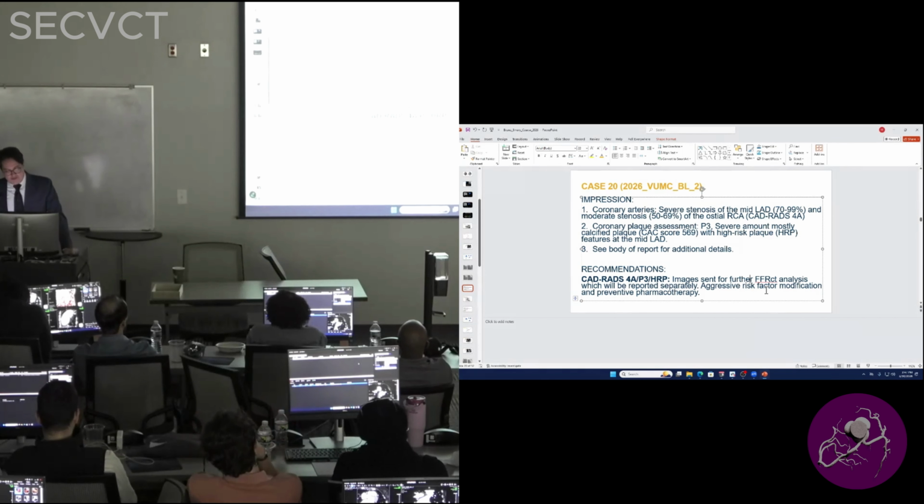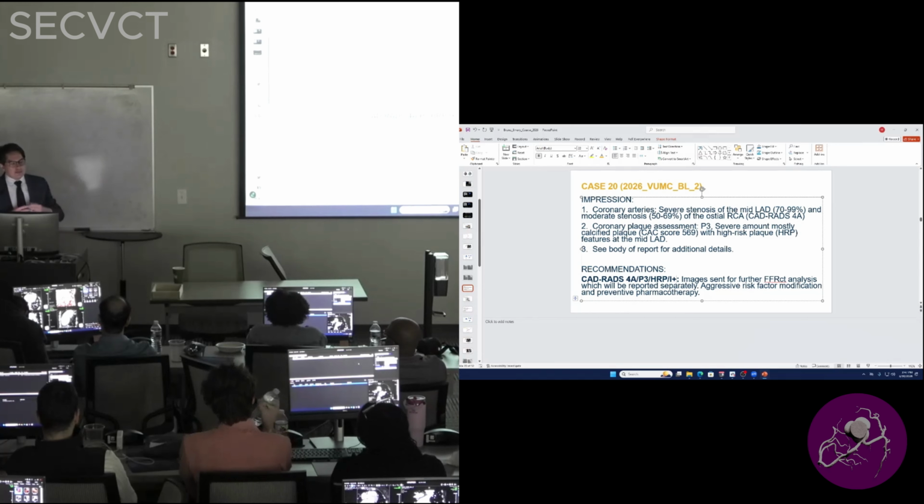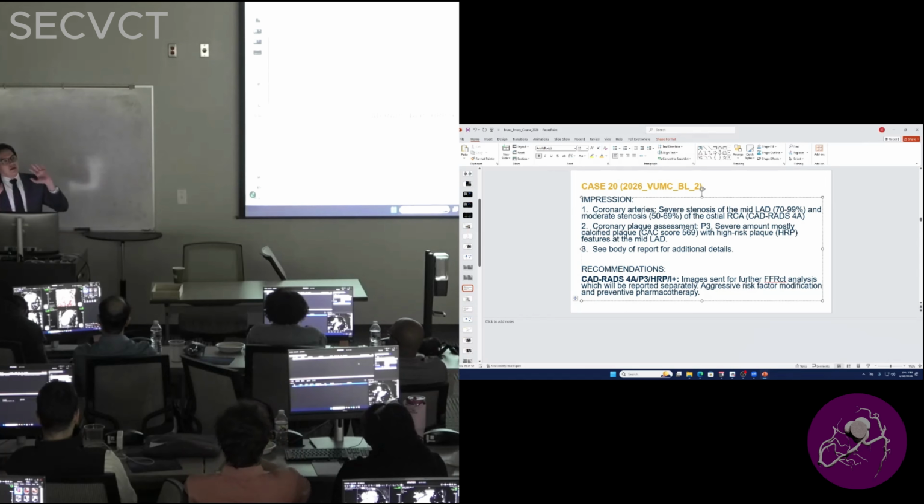So we sent the FFRct analysis. It was FFRct positive, so we can add I plus here, right? I plus because FFRct is functional testing. Also, in some places, maybe a few places in Europe, they do CT perfusion more; we don't do it frequently here in the US. But if CT perfusion is positive, we also put an I plus.